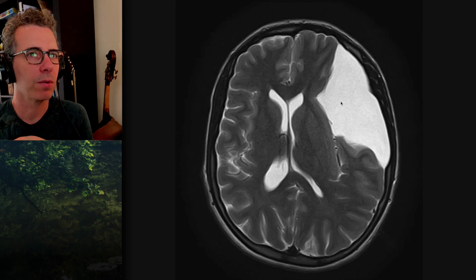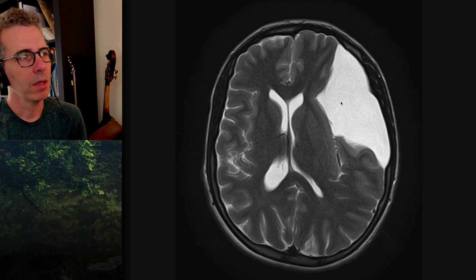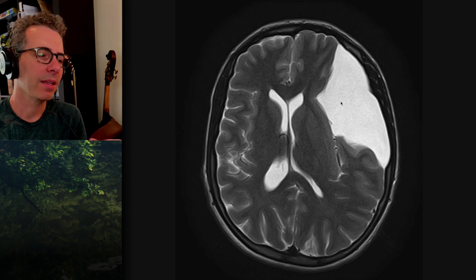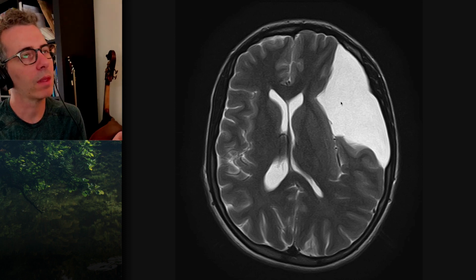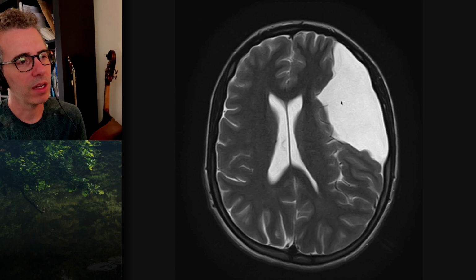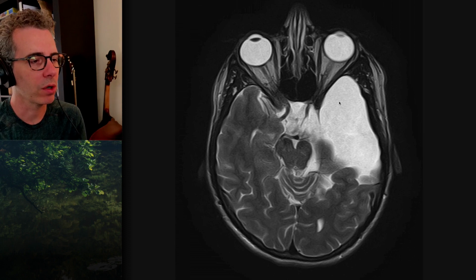Right. So whenever you use relative terms like hypo or hyper, you have to make sure that it is clear what you're comparing it to. Yep. So if there's a lesion in the middle of the white matter and you say a hyper-intense lesion, then it's clear that you're comparing it to white matter. But if it's not clear, then hyper and hypo are relative terms, so you have to say compared to what.